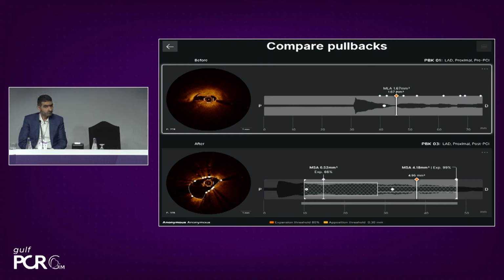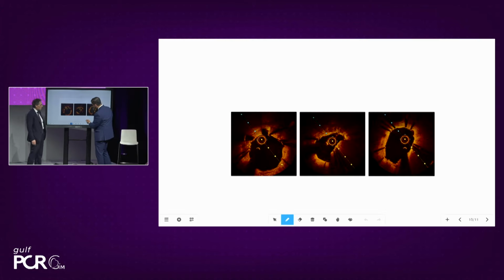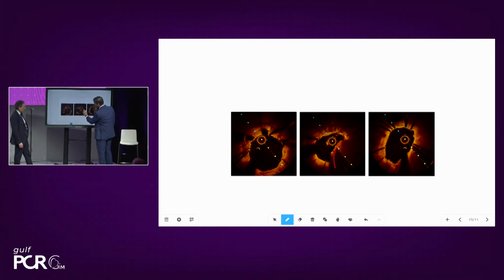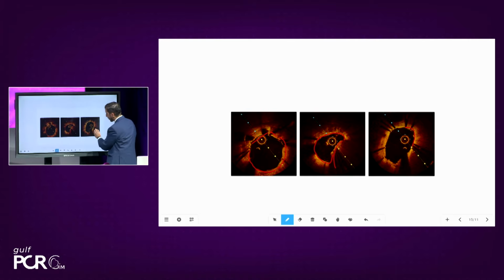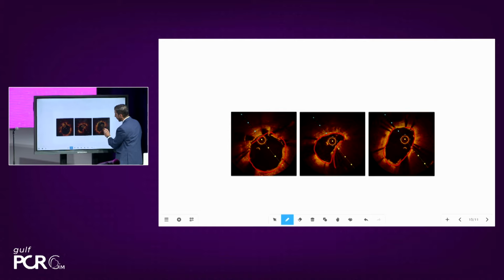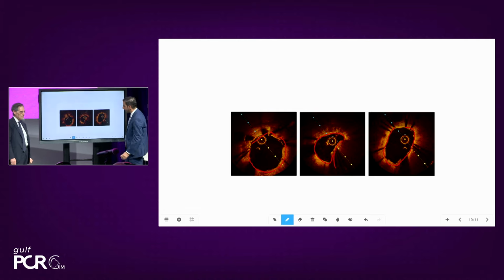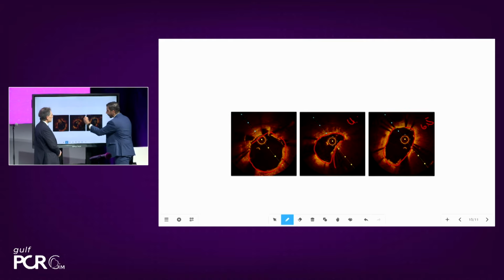Let's have a look, Mahmoud, at the next slide. So I think you could have predicted by these findings where the fractures are, where the stent is going to expand in this case, and we see it here at the nodule area. So we expand out laterally where those fractures occurred. Here we have a nice area where there's calcium, but this is that fibrous area lesion here. We had that recoil, and we have this eccentric expansion of the stent with diameter loss. Less expansion here, and this is where we had that 6.5. This is where we had that 4.9.